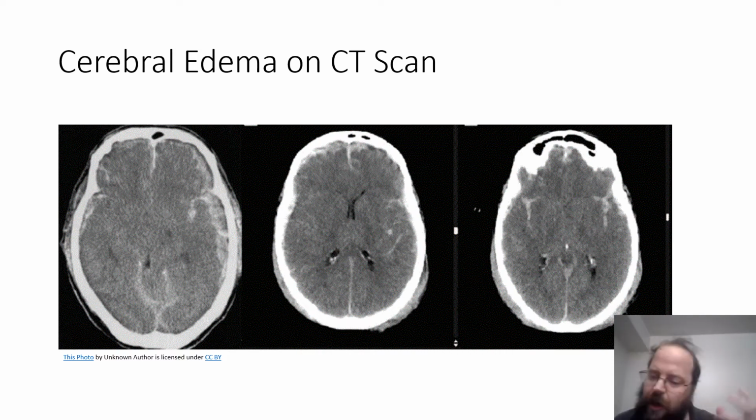All right, next is cerebral edema. Skull fractures are common, but not necessary. Even in a great amount of brain traumas, you won't see that as often. This you will see a lot. Cerebral edema, which is swelling, which is where the parenchyma, the tissue of the brain, swells up and squeezes itself within inside the skull. This is cerebral edema ongoing.